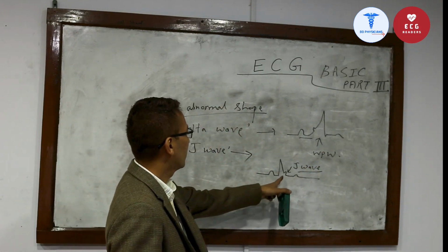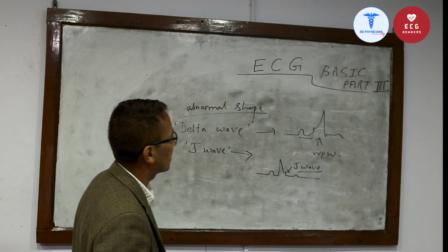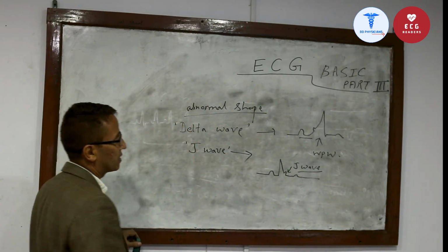This J wave occurs at the beginning of the ST segment, and it occurs in so many conditions.